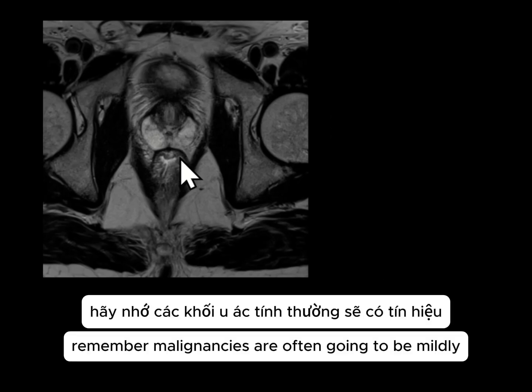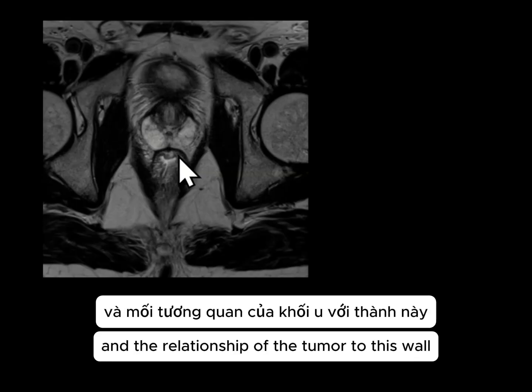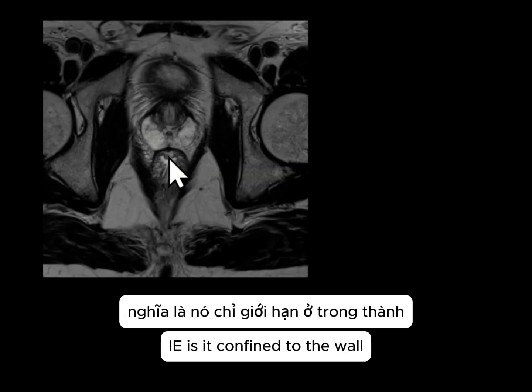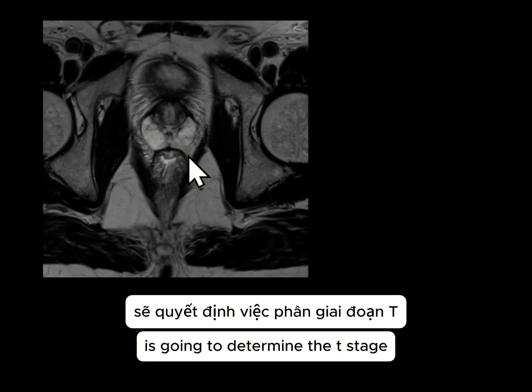Remember, malignancies are often going to be mildly hyperintense to muscle on T2, and the relationship of the tumor to this wall, i.e., is it confined to the wall, beyond the wall, and how far beyond the wall, is going to determine the T stage.